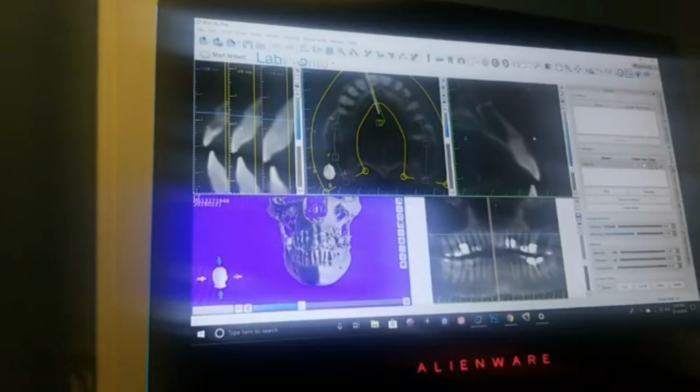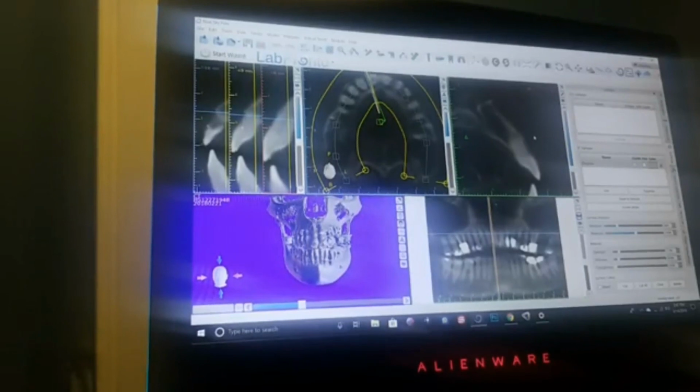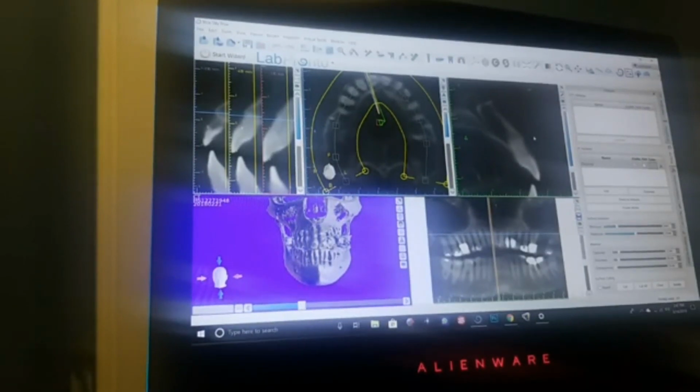So my recommendation is, if you're working on the same patient on both jaws, take care of one jaw, finish your treatment plan, make sure it's good, and then go into the next jaw. As far as whether those implants are going to be in relationship to each other, for example, you're doing an upper left side and a lower left side, and you want to make sure that those implants match well together, you are going to be able to see that once you start treatment planning it.